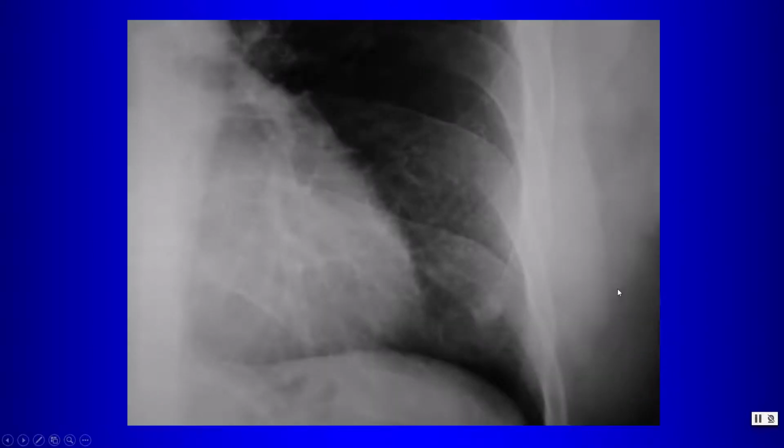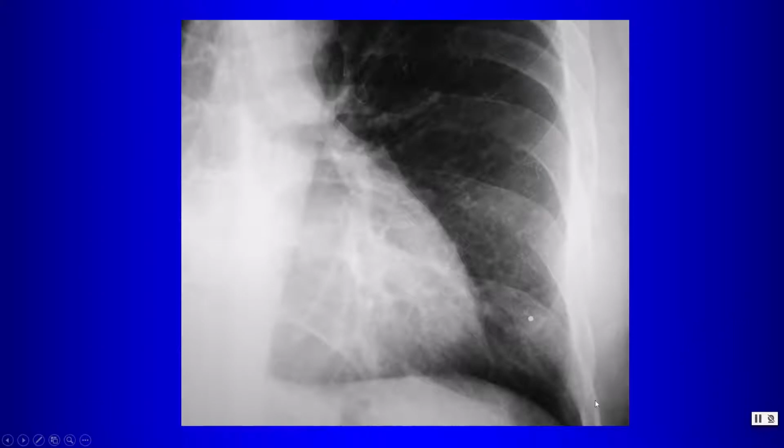So starting with a common problem that we can see on chest radiographs, sometimes we will see a nodular opacity like this overlying the lower portion of the chest. And the first question that comes up is: is this nodule really in the lung, or is this a nipple shadow? Usually the way we resolve this is with a repeat radiograph using nipple markers, and if the nipple marker corresponds exactly with the location of the nodule, then we assume that this represents a nipple shadow.